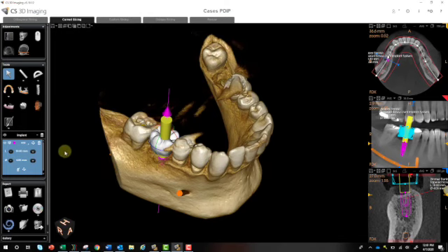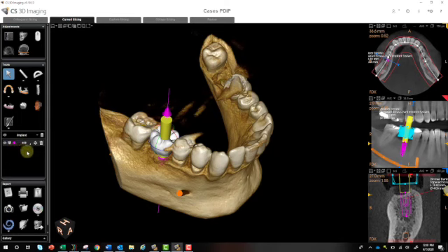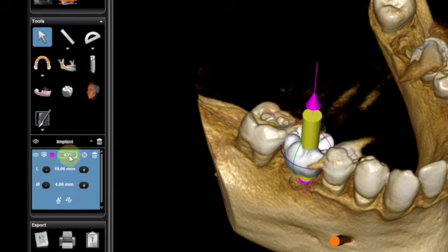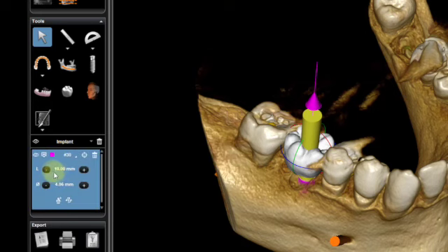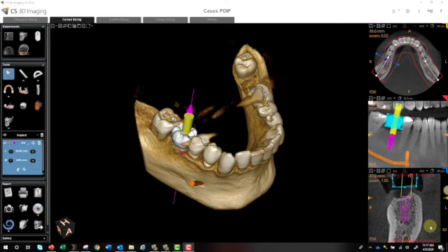Or on my left hand side, you'll notice this whole blue area is opened because this is an implant on number 30. I can left click and it will close that whole window, or left click again on the bar, it will open the entire window. And now you can see actually a variety of options here, which I'll go through in a minute. This little button right here, Show Hide Object Properties, is there whether or not the blue bar is open. And if I select this, then you can see my object properties are now gone. So now we can more easily manipulate our implants.